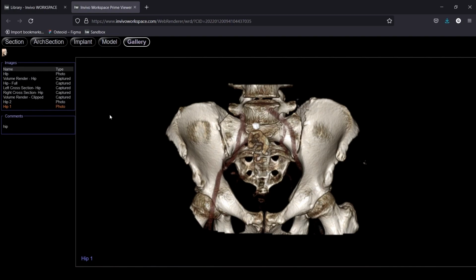So today we've covered how to take images and send them to the gallery, how to do the lay an egg process, which is saving your case and combining it with a viewer to view stuff on local computers. And then we also talked about how to send your case to the cloud so that you can view it anywhere that you have a web browser.